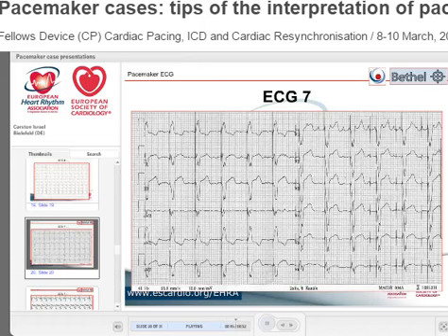As soon as you see that the sensed events overlap each other, that means every sensed event triggers a short period. If the device has the next atrial sense within this short period, again and again and again, until, let's say, 1 second, it says, okay, this is continuous sensing.